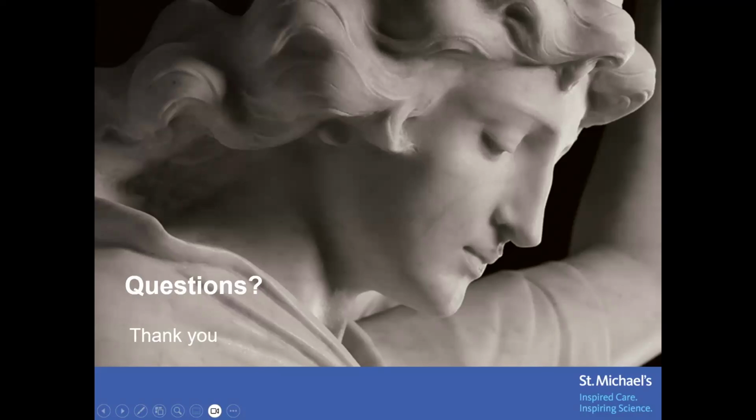I was just going to say, I think it's wishful thinking that you can get that. Yeah. The contour is like a mountain. So when you actually do flow studies, the central one has the highest and the 2 are lower. Right. So people have done flow studies within a water tank way back when they first came out, and each of them has a unique profile. And when you do the CW, basically you just look through everything. So you end up capturing the whole profile together, and you end up a little bit higher, which is fine, but just recognizing that it is a little bit higher, but not that much higher overall.